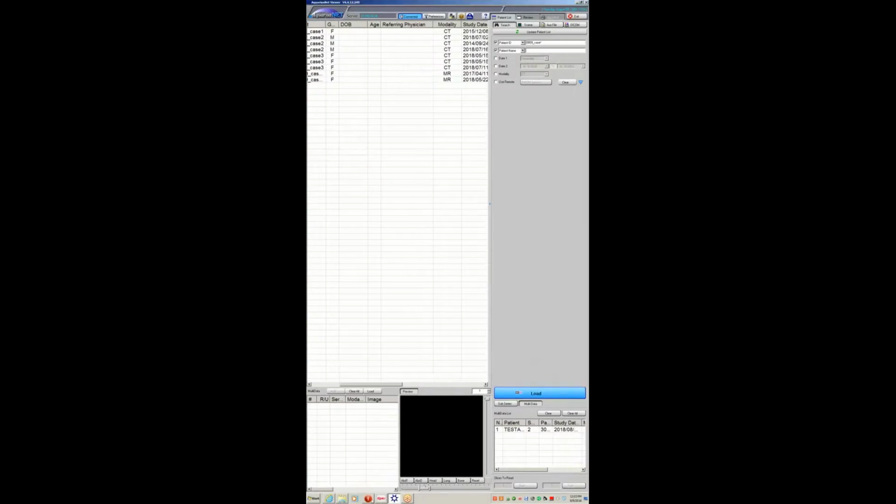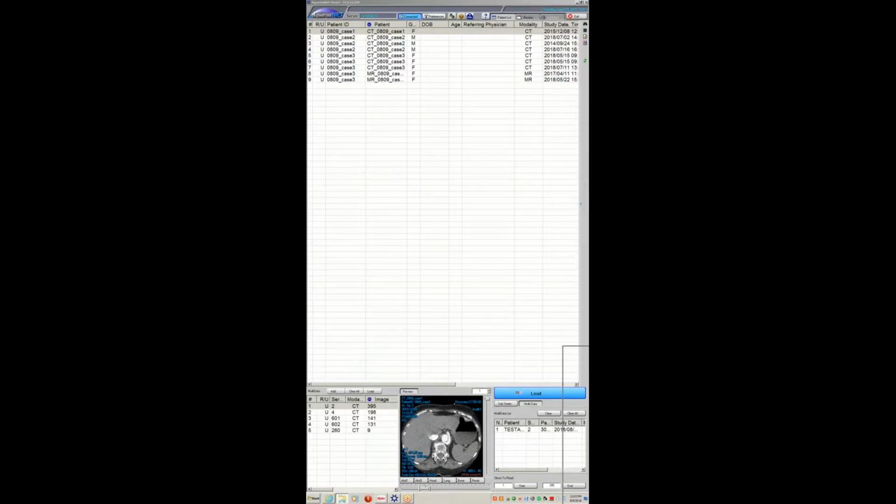I can, if you give me a second, I can pull this up. Let me do this. 809 case. All right. Yeah, let me just make sure everything is kosher here. All right. So let's see here. Let me pull over the echo for this because this is pretty cool.